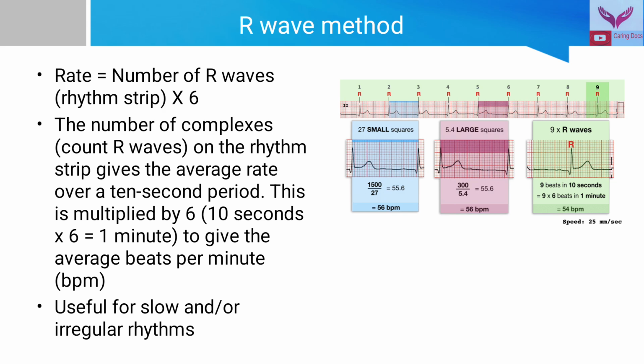As we know, 1 second is equal to 5 large squares. So in 10 seconds we will have 50 large squares.